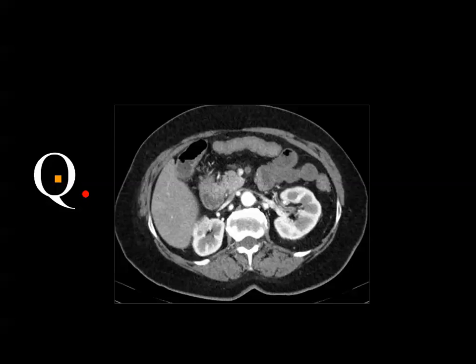The head of the pancreas, what? Okay, and this is a CT scan of the abdomen after intravenous contrast injection. This is the head of the pancreas, and this is part of the duodenal loop containing fluid, like this loop. And what's wrong here is this vessel. Yes, and this is devoid of enhancement, meaning that it is thrombosed.